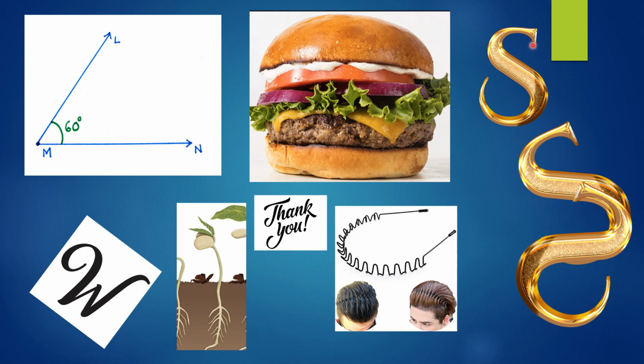From there, you're going to make the S shape. And once you're familiar with the S, add a tail onto that S, which is basically your amygdala, hippocampus. This is the dentate gyrus. And then as you turn inferiorly, it is going to be the subiculum, uncus, entorhinal cortex, and parahippocampal gyrus.